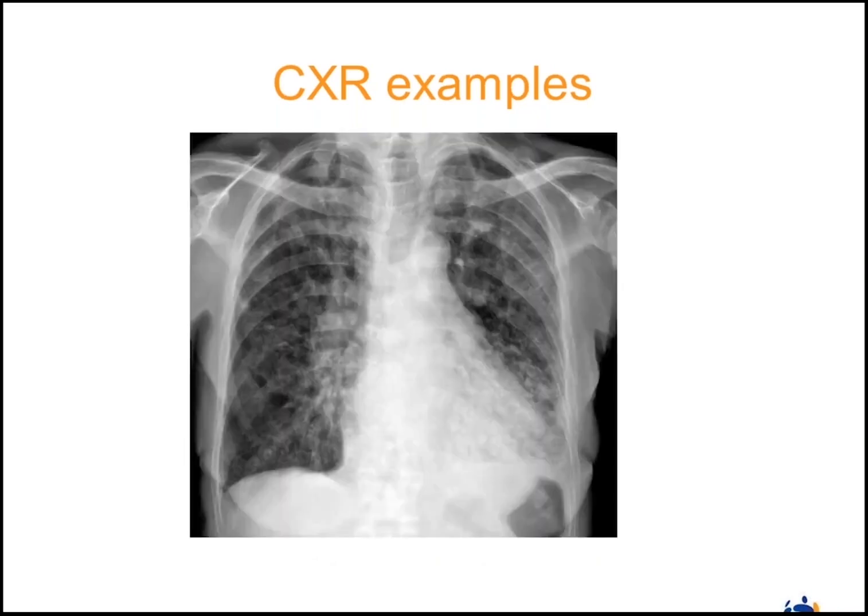Here's another example. This was performed on a 67-year-old female patient who has a background history of bronchiectasis, and her shortness of breath has been worsening. She does have a small pleural effusion, which is atypical, but she has multiple peripheral foci of consolidation. She has left lower lobe bronchiectasis. There's another focus of consolidation here in the left base. So this is an indeterminate study. Really very hard to look at this chest X-ray where there's pre-existing disease and be certain of a diagnosis.